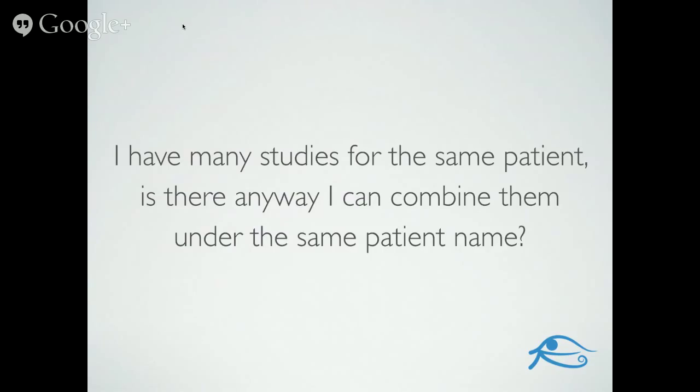So for example, if you're working in a hospital and a patient has had several imaging studies done in your hospital, and a patient has brought in outside imaging, and that outside imaging has probably a different medical record number because the patient was seen in a different facility, probably has a different spelling or use of case in the patient name. You can now unify the imported study and with studies that are in your PACS environment, in your cloud account.